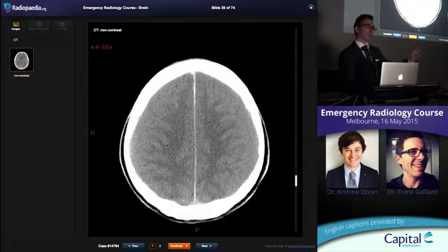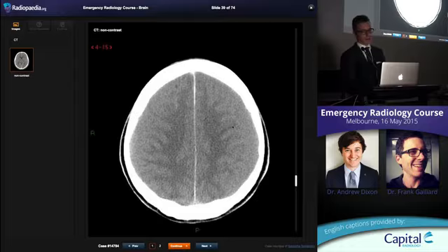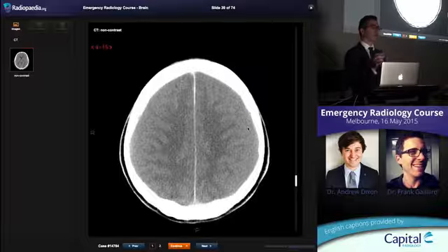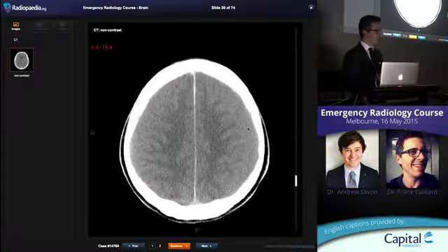And subdurals, we said, they went from very hyperdense to very hypodense, similar to CSF. That means at some point they have to be intermediate, and they go through a point where they are isodense to cortex, and you can't distinguish the two. So the clues are the white matter should come out about a cortex amount away from the inner table, right? Because all that there should be between white matter and bony cortex in a full young brain is brain cortex. In an older patient, well, that's easy because there's going to be lots of CSF surrounding it. But here, the closest white matter you can find is back here.